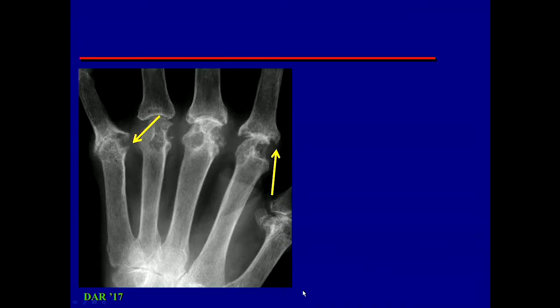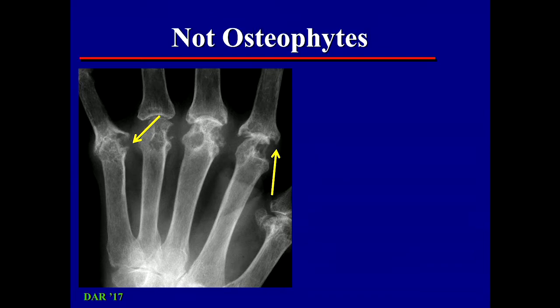Are these osteophytes or not? And the answer is no, these aren't osteophytes. Why not? These are not extending beyond the edge of the normally shaped bone. What this is, is a patient with erosions.